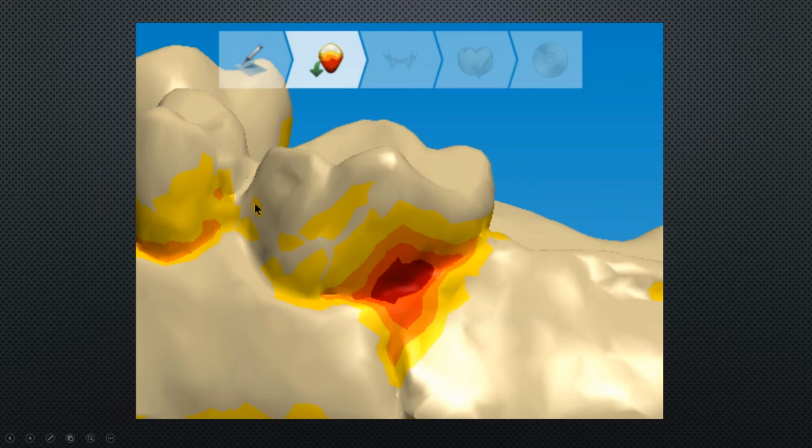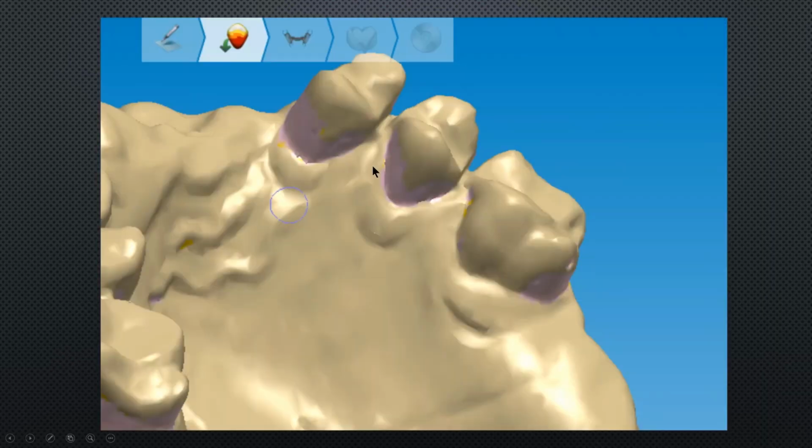Now, if you look at this case, it's a little light on undercut here, right? We're going to gain a little bit of retention, but it's a little light. The cool thing about these materials is if you do find that the retention possibly will be light, you can actually gain retention from the lingual. On a metal framework, the major connector has zero movement. And so you've got to totally make it passive on the lingual. With these materials, they have flex and they can move into those lingual undercuts.